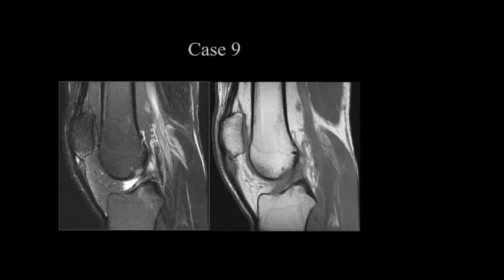There is also an increase in high signal intensity in the lower patellar surface and the inferior patellar ligament, which may be an area of injury or tear.